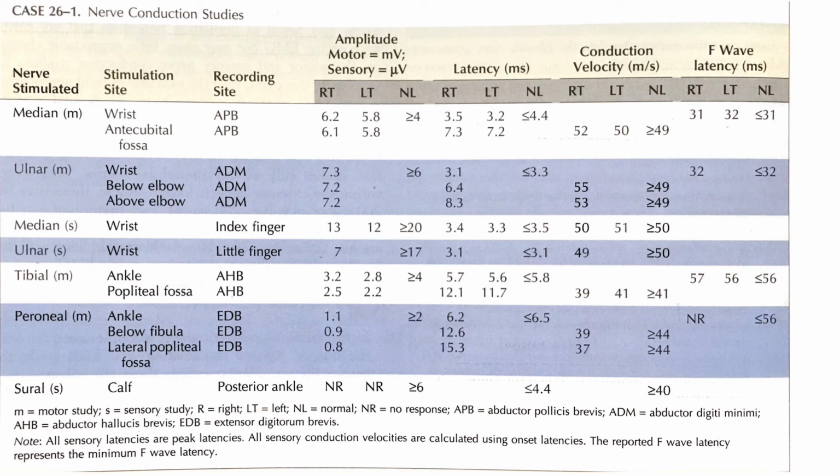So say for example here the sural sensory nerve is no response. However, for the ulnar and median sensory nerves have reduced amplitudes with preserved latencies and conduction velocities, which is typically a characteristic feature of axonal neuropathies in a length dependent pattern, further signifying the diabetic neuropathy. And similarly, in the motor studies, we can see that first, when we focus on the peroneal nerve, on the motor nerves, we can see that it has severely reduced amplitudes with relatively preserved latencies.